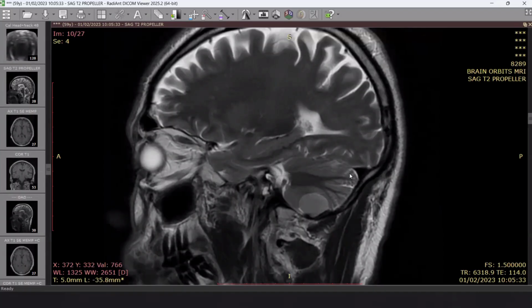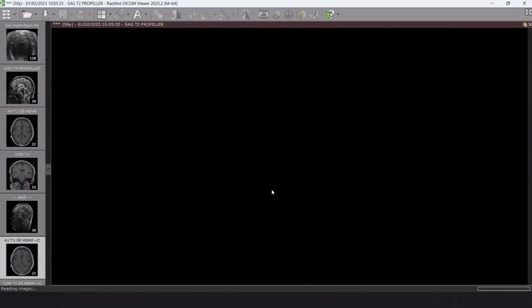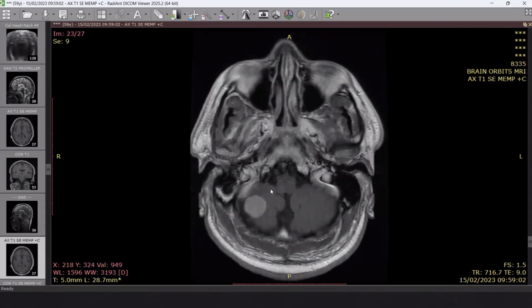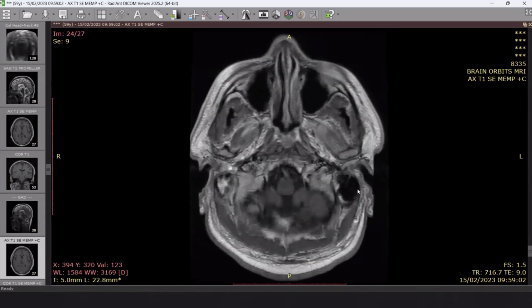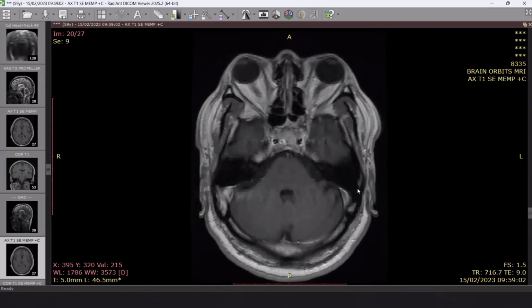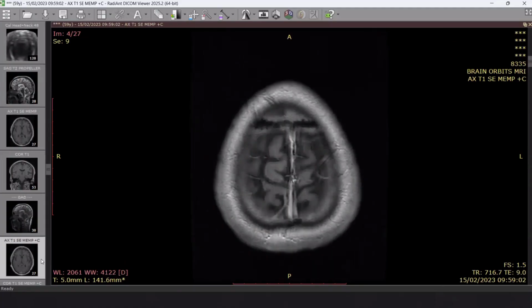Do you think that the contrast-enhanced study will be helpful? Okay, sir. If available, please show me this. Let's see what I think this is. Sir, it is showing intense, smooth, homogeneous enhancement. Yes, strong intense homogeneous enhancement, and we don't have any other lesions.